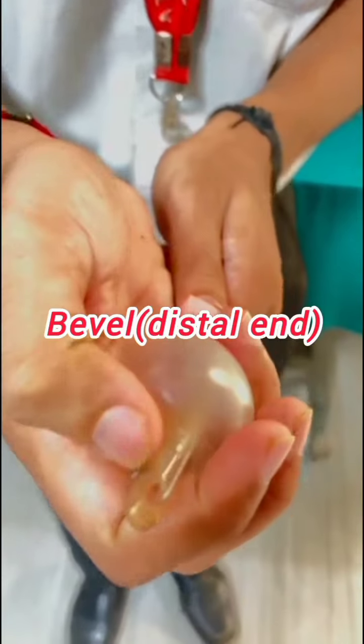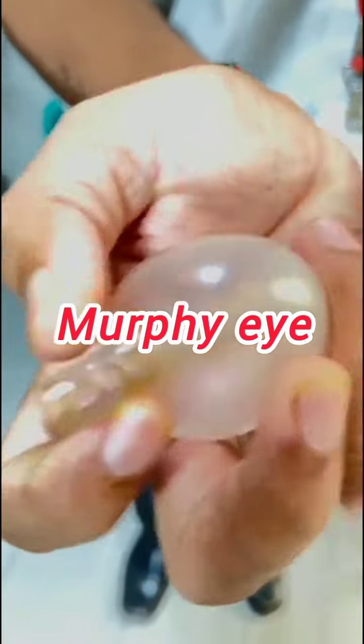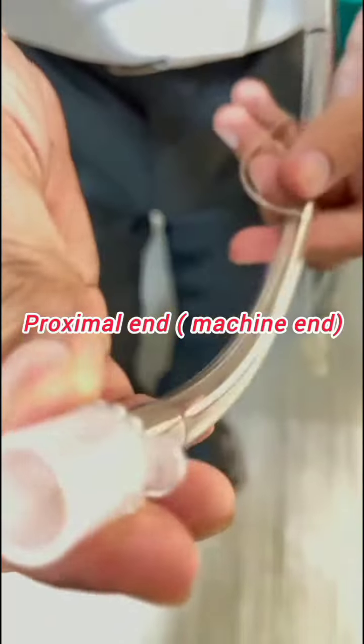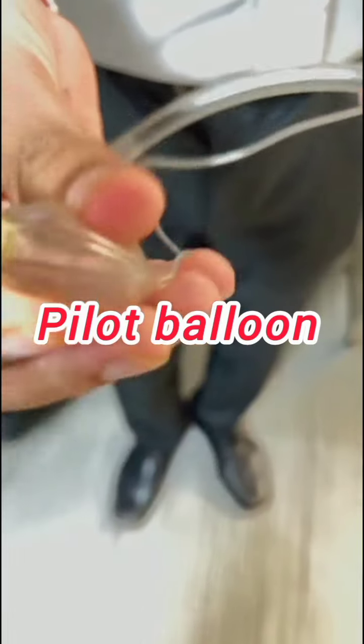So here you can see this portion is called the bevel. A side hole near the bevel is called the Murphy eye, you can see. And this is a curved inflatable balloon, the cuff. And now here you can see this mark is called the vocal cord marker. This portion is called the proximal or machine end. It is also called a connector, to connect with the machine. And you can see this portion is called the pilot balloon.